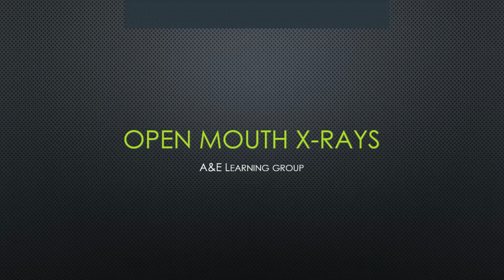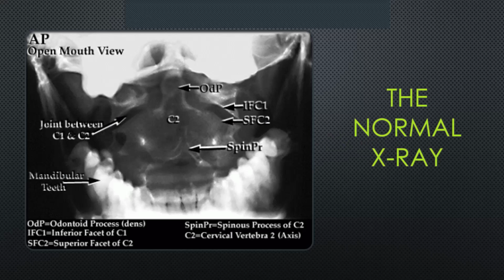We're just talking about open mouth X-rays of the C-spine. Open mouth X-rays of the C-spine are one of those X-rays that you would do quite commonly in a trauma setting. I found a lot of people do order them or don't order them sometimes, and when it's needed, and even when ordering them, sometimes I'm not sure exactly what they're supposed to be looking for. So in this short tutorial, I hope to break it down for you so that you know more or less what we are looking for and why we are looking at an open mouth X-ray.